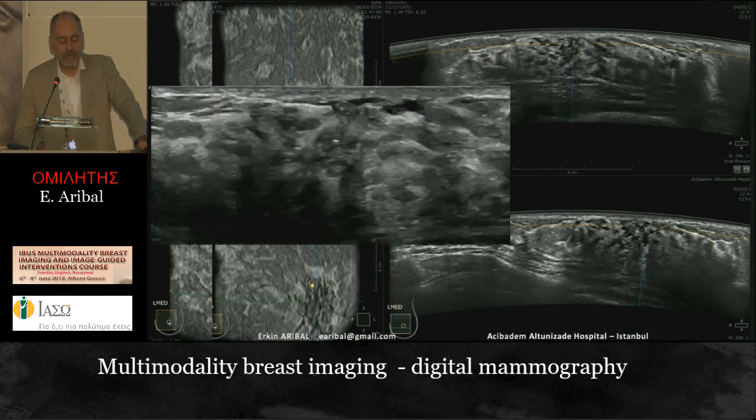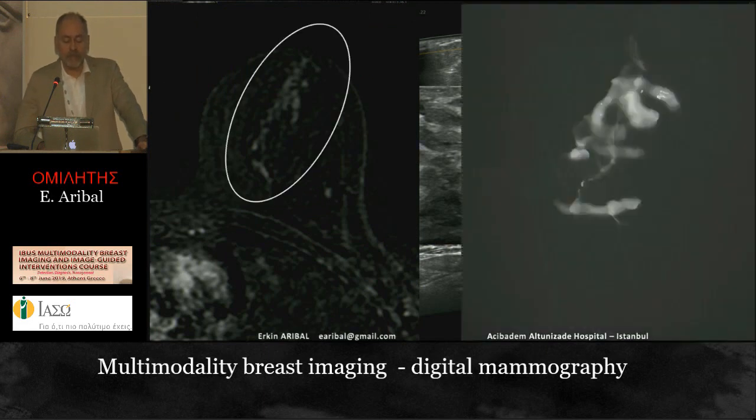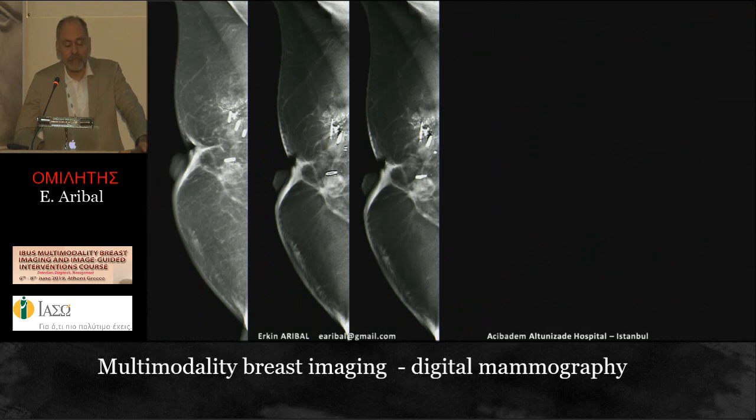And this is the identical image on handheld ultrasound that we did the biopsy under. And here you see the calcifications on specimen radiograms. You should always do this if you're doing them. This is a case of a breast cancer patient. Same, it's the surgery bed.